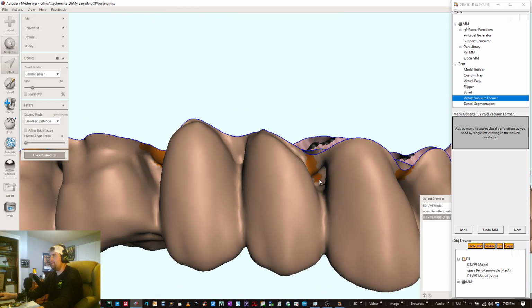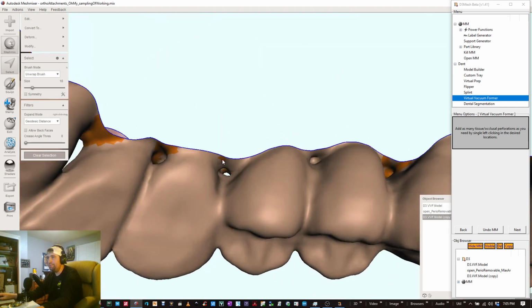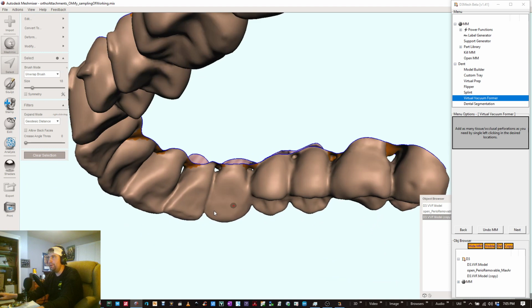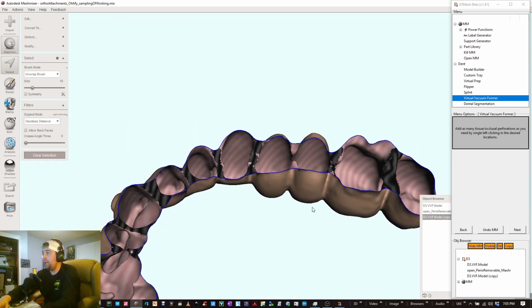Alright, come on, just work. If after all this it doesn't work, I'm going to be pretty frustrated. That's what I get for going off script, though. Okay, are we close? Oh, looks so sketch. Optimize, it looks a little bit better.